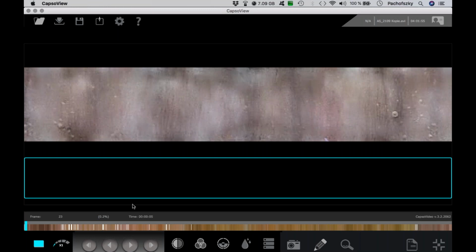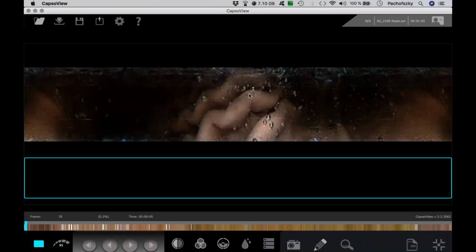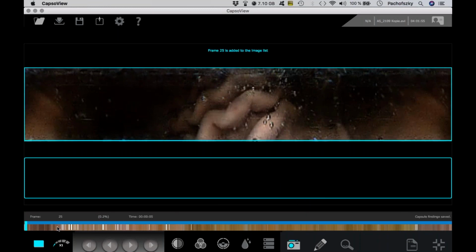I will mark now the esophagus. So here maybe, but you can see it's quite black. We have here one thing, but here we can say yes, we are sure this is a gastric picture. From the color change here in this area, I'm not sure.